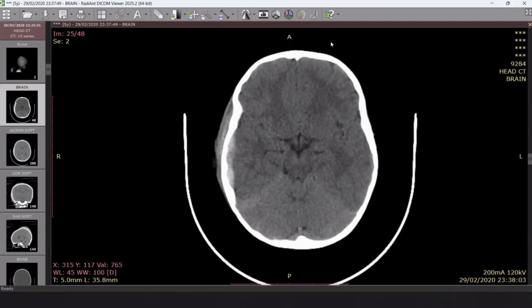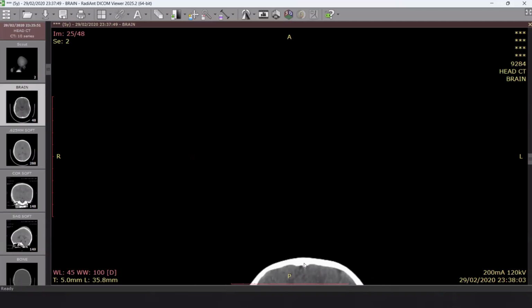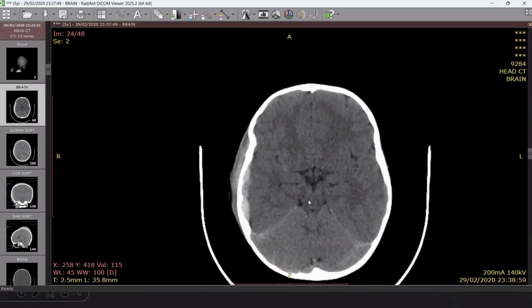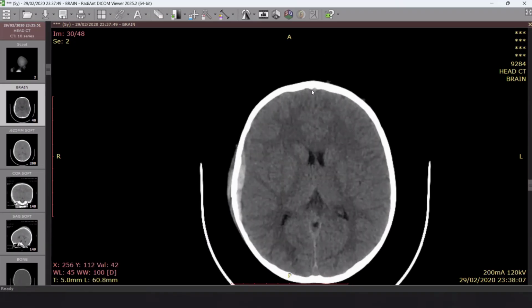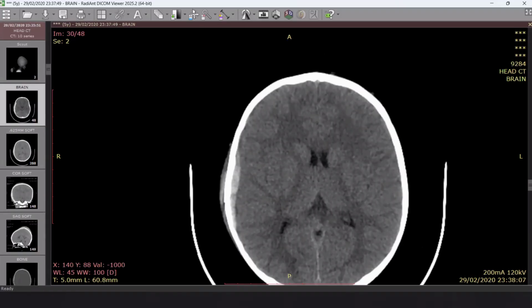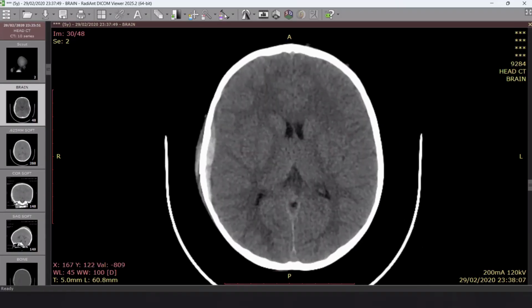Sir, because you have mentioned the midline shift, very important points. Sir, we have to draw a line from here to here. Just a minute. Okay, keep the control with me, please. Okay, sir. So we will draw a line. Just a minute to remove this one. We will draw a line like this one.